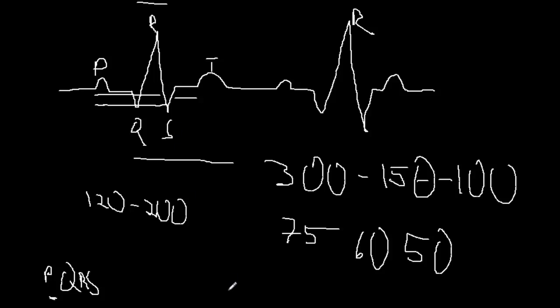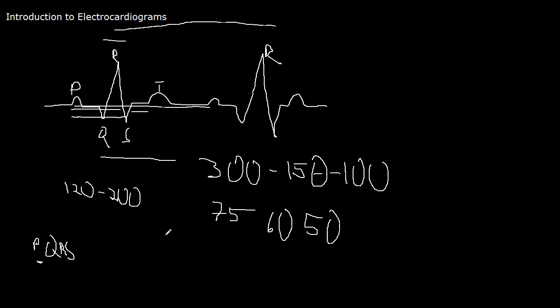The way you'll see that on an ECG is you'll see regular P-to-P intervals. If you take calipers out and you measure this distance, and then this distance to the next one, they'll be the same, and then you measure the R-to-R intervals and they'll be the same, but these have no relation to each other. So when you're interpreting ECGs, ask: is there a QRS after every P wave? Is there a P wave before every QRS? If that is not true, then they likely have third degree heart block or complete heart block.